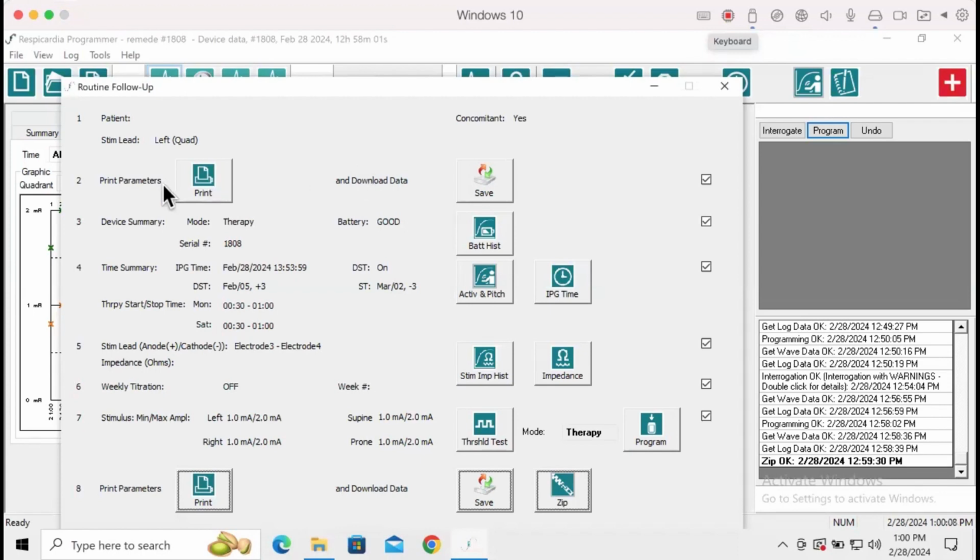During a routine follow-up, two critical steps involve verifying the correct data download and preserving PDF files containing parameter settings. Therefore, it is crucial to know how to properly download Remedy device data and save pre and post parameter settings PDF files on Remedy Model 1001.